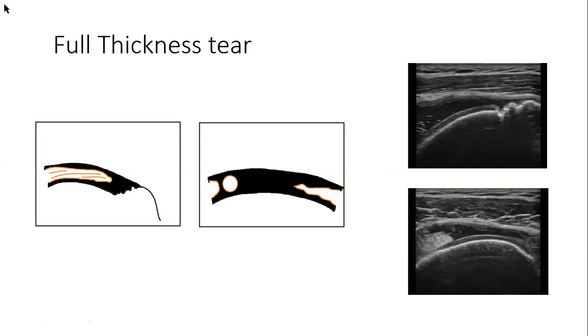Yeah, I think with the majority of the people that I scan, those tears are really old, and initially that's why I had a lot of trouble seeing it, because it was filled up with that fibrotic tissue. And also over the period, this interface that you see here, that's the bursa, right? This bursa also thickens and herniates into the space, so it gives you the illusion that maybe some fibers are intact here.